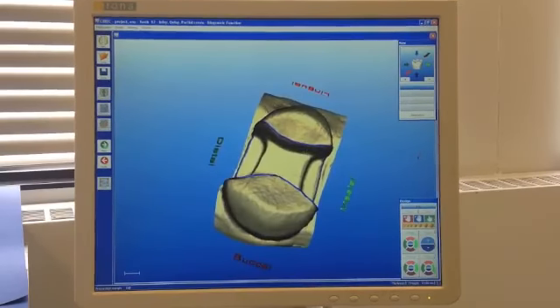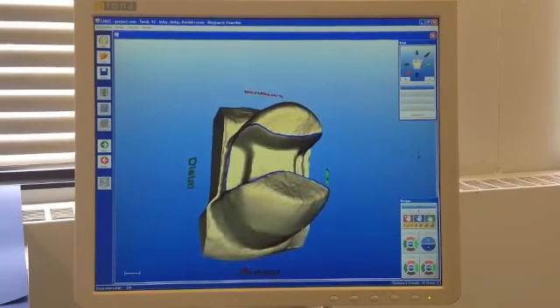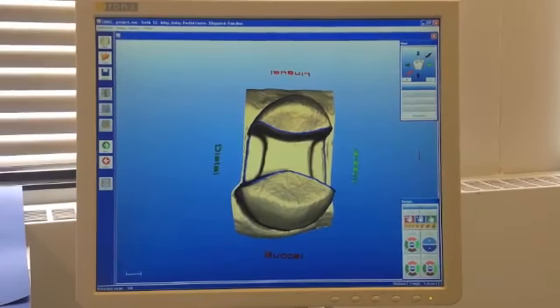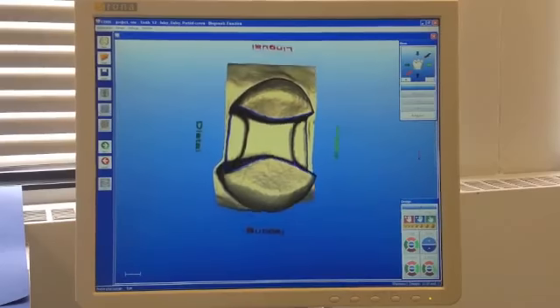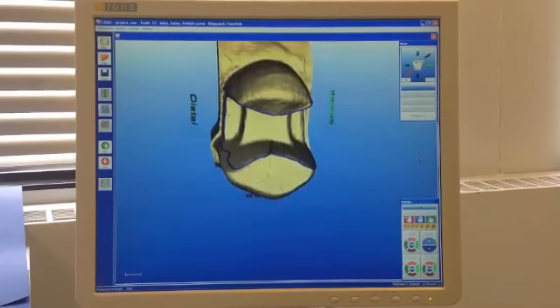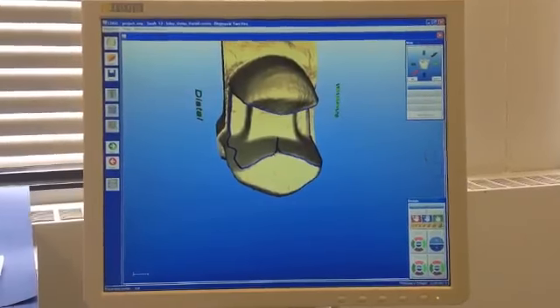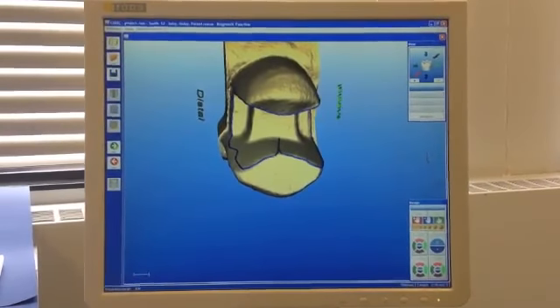The margin for this tooth is almost done. It is time now to rotate the tooth, and you're going to check the margins everywhere. You see a problem like that? Don't worry, do not freak out. You can easily fix this problem here.